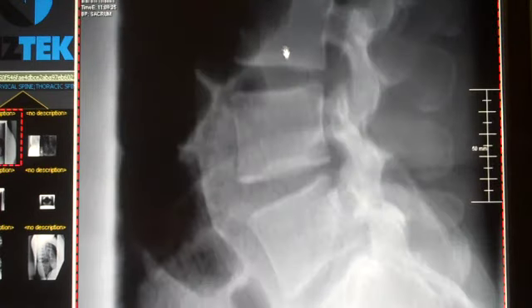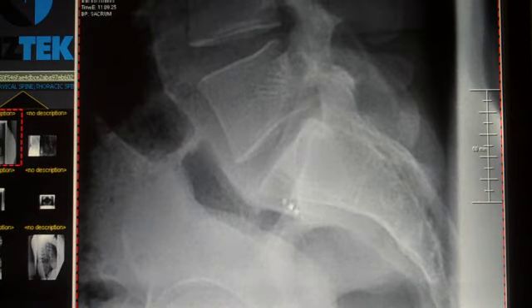If I move this on down so that I can see the sacrum a little bit better, this would be, of course, our sacral base, right along here. The sacrum does have a superior articular process. These would be the segments, and we can even see the segmental end plates right here in the sacrum. The dark area right behind this would be the canal, and then back here would be the crest. And just as dark as the spinous is back here in this area is the sacral tubercles. The anterior superior corner of S1 is called the sacral promontory, and I do still see this gas pattern coming on down.